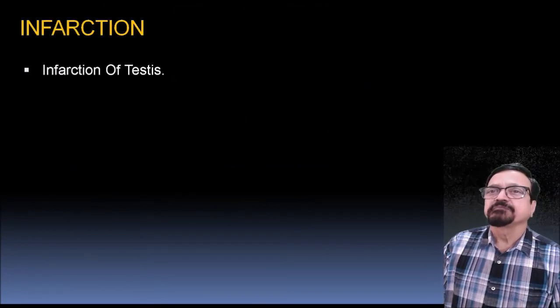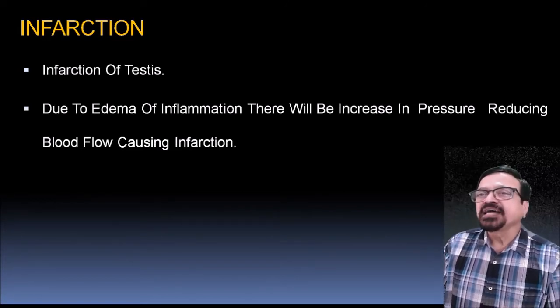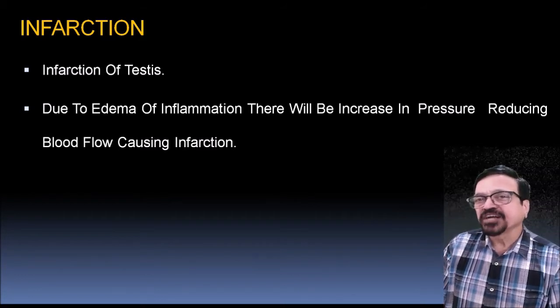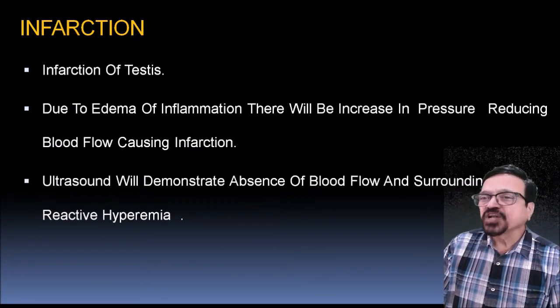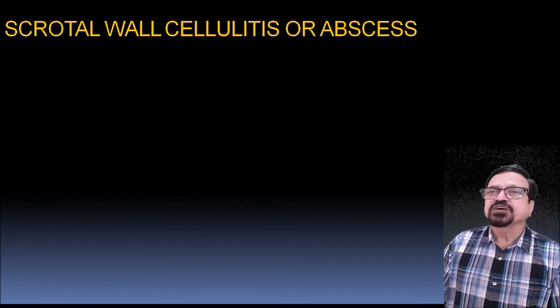Infarct of the testes is due to edema or inflammation. There will be an increase in pressure, resulting in compromised blood flow causing infarction. The ultrasound will demonstrate absence of blood flow and surrounding reactive hyperemia in case of infarct.